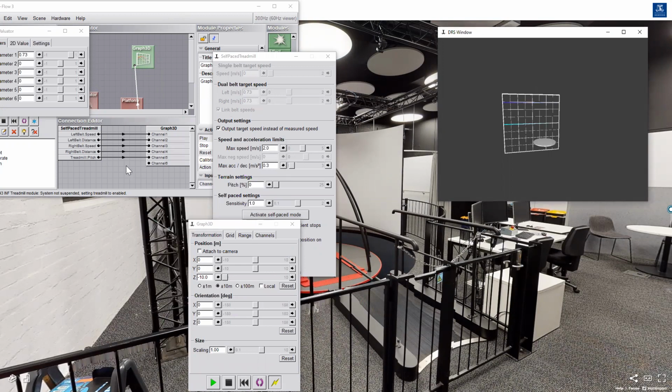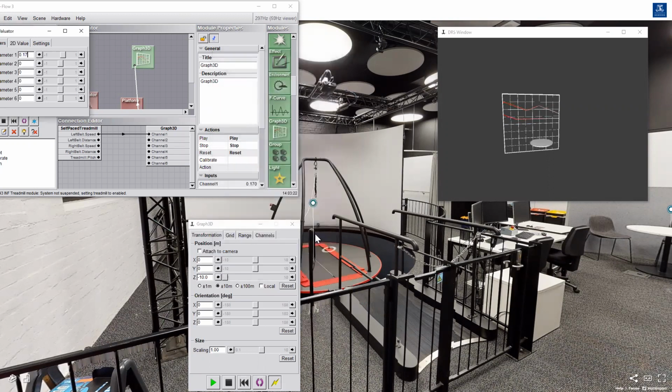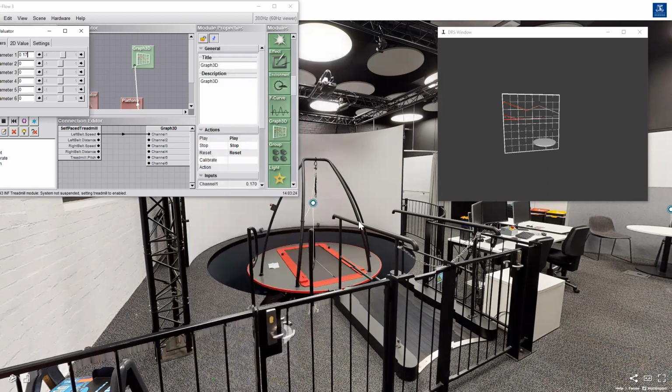So I can actually delete most of these. Let's just leave you one example, for instance, belt. And you can see the changes that happen. Do you see that? In the meantime, real time. So we created a real time emulation of this big system. And you can also do the application and understand what could happen, and then take it to the lab as we discussed. Hopefully this would be of interest, and let us know if you have any questions or suggestions.